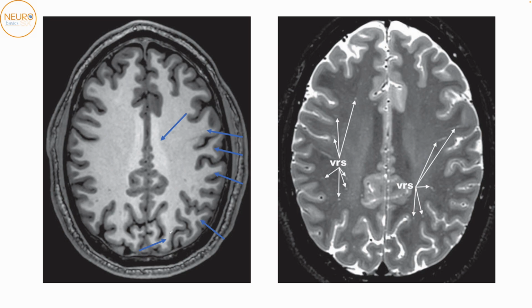Again, we have not yet reached the occipital lobe, and the way to identify the occipital lobe is when we reach the atrium. Until we reach the atrium, we don't consider this region to be the occipital lobe. So this is still the parietal lobe itself, probably the region of the precuneus. And this is the angular gyrus and this is the supramarginal gyrus.